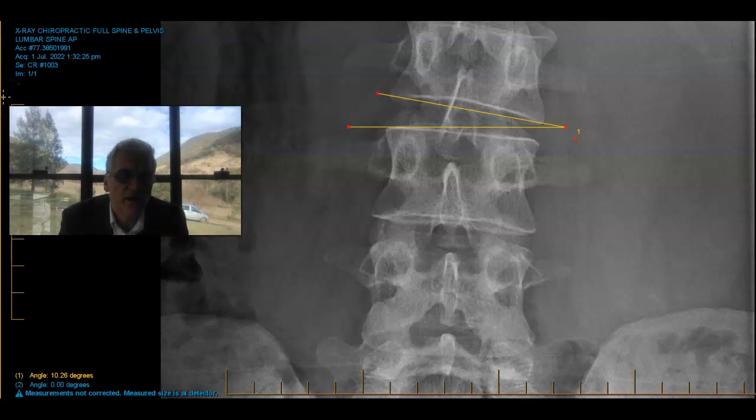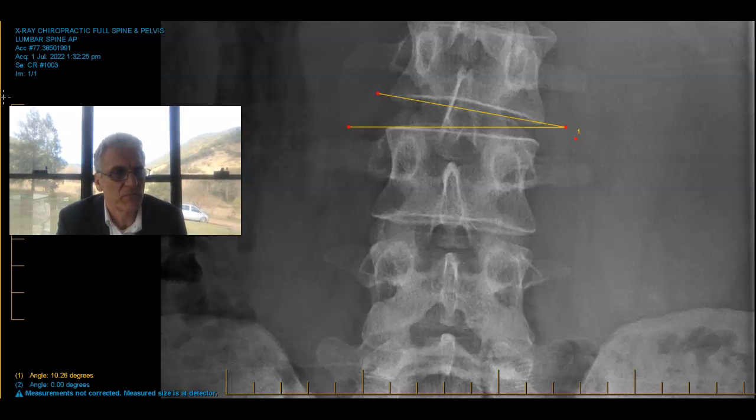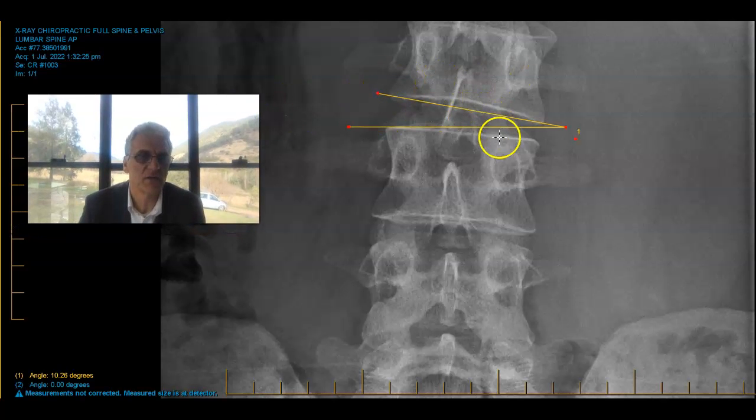When we're looking at X-rays, we really do need precision, and there are ways in which we can use IntelliViewer to maximise our feedback, positive feedback, which helps direct treatment programs. Now, in the case here, I've started to measure this gentleman's X-rays down low, and I thought I'd take you through that as well. I'm going to look at ways in which we can fudge results, and we don't want to fudge results at all.